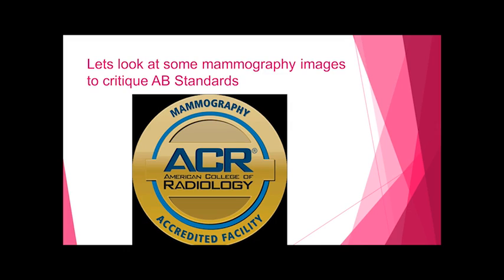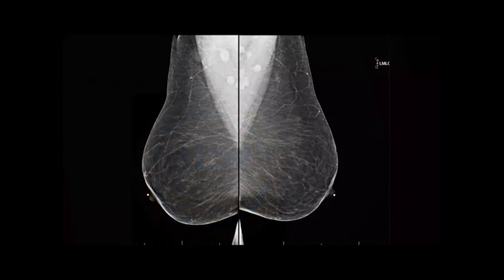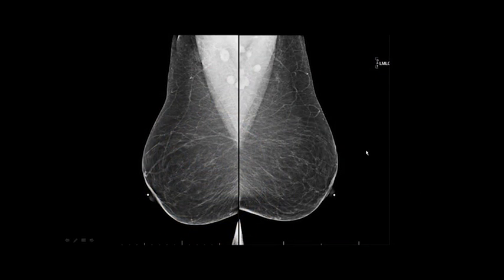So let's look at some mammography images to critique for accreditation body standards. So these, I like the muscle. I like they have the tail of the breast there. The nipples are in profile. The bottom of the breast isn't perfectly horizontal, but I don't like the IMF. See, the IMF shows down here, but not on top. So these I would not send in.